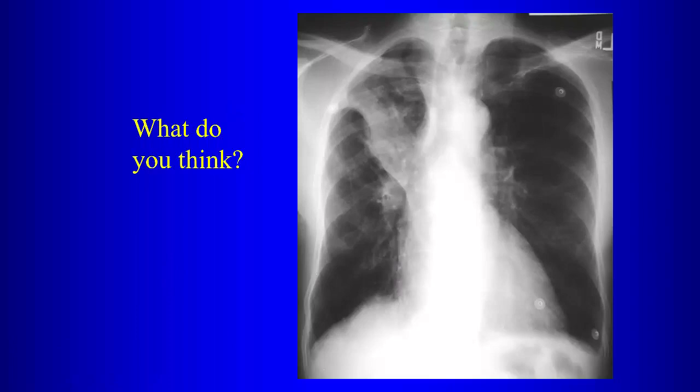Okay, this radiograph. What does anybody have to say about this? Well, can we have somebody besides Jose participate here? Yeah, so there's right upper lobe atelectasis. Yeah, so what's the S sign of Golden? You see like a bulge of the horizontal, oblique fissure? Yeah, there's a bulging here of the fissure, so the significance of that is what?